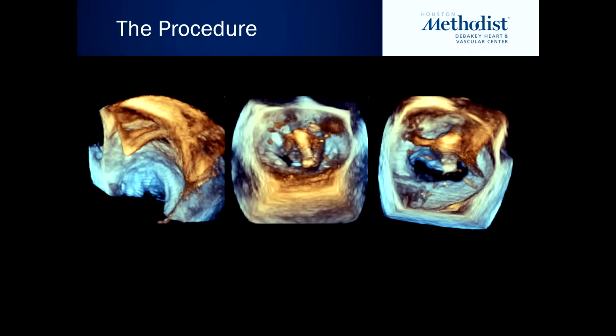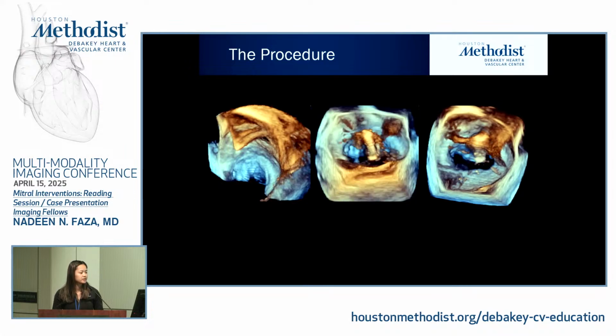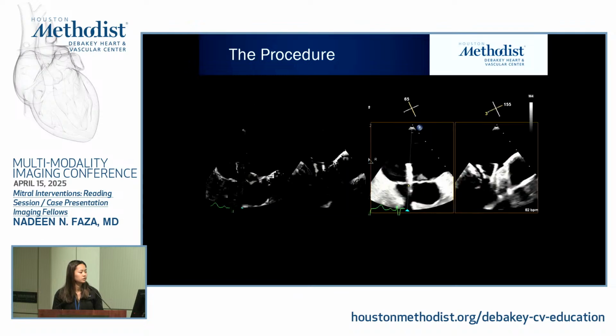The difference between the middle and the right is that on the right, they try to point towards the medial side and target the medial side of A2.